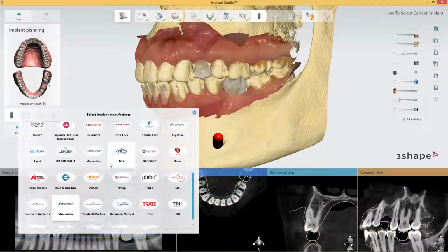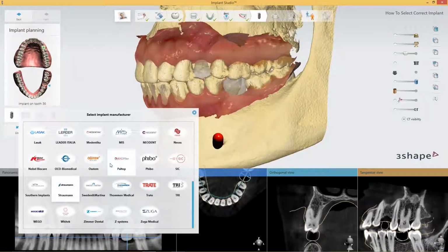Yeah, makes sense. But yeah, not many. I think in total we have more than 50 implant libraries, and that list just continues growing, and it's great, and it's something we're really proud of also, that we can bring all of this original data together into our software platform. But we also know not many use all implants like you do here, but this is to show it. Yeah. And also if you import them all, because sometimes it's good to have them, they are free for the users, so you can install them all.